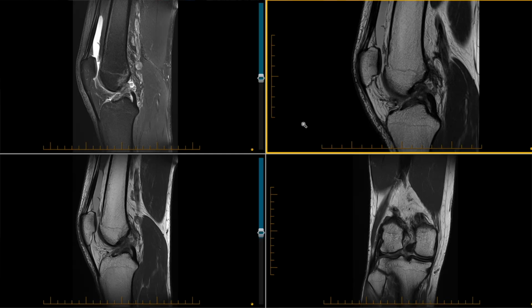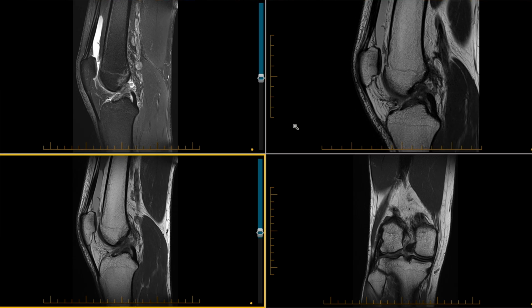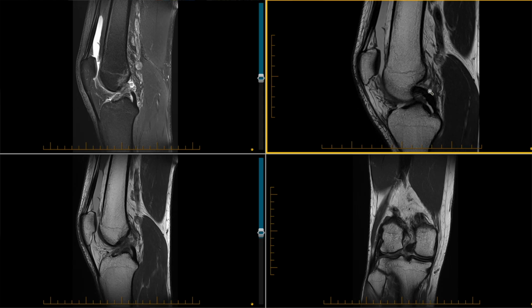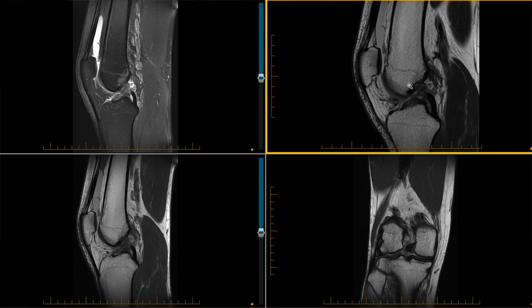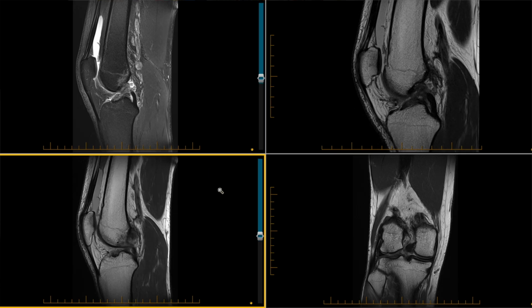This is a case of a type 3 non-displaced ACL rupture. On these sagittal images, you can see that there is a proximal segment ACL tear with a bare femoral footprint of the ACL, with the ACL tissue largely retracted down from the native femoral footprint, consequent of an avulsion at the femoral footprint of the ACL.